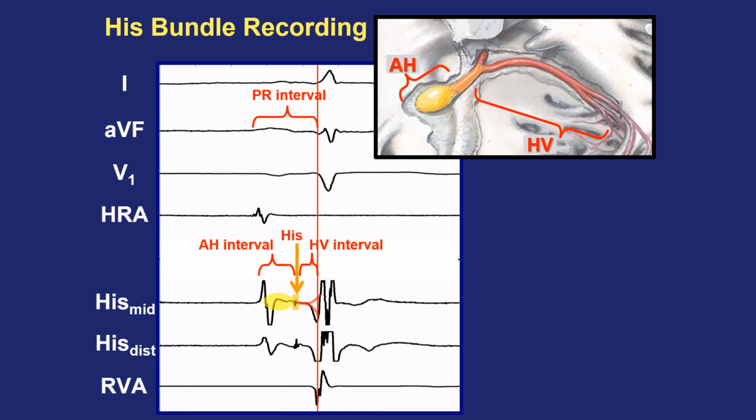And in this way, we can look when patients have a long PR interval or evidence of AV conduction block where the problem is located, because if there's a problem with the AV node versus a problem with the His-Purkinje system, there are very different implications in terms of the timing of progression and the safety of the patient, dictating the necessary treatment.